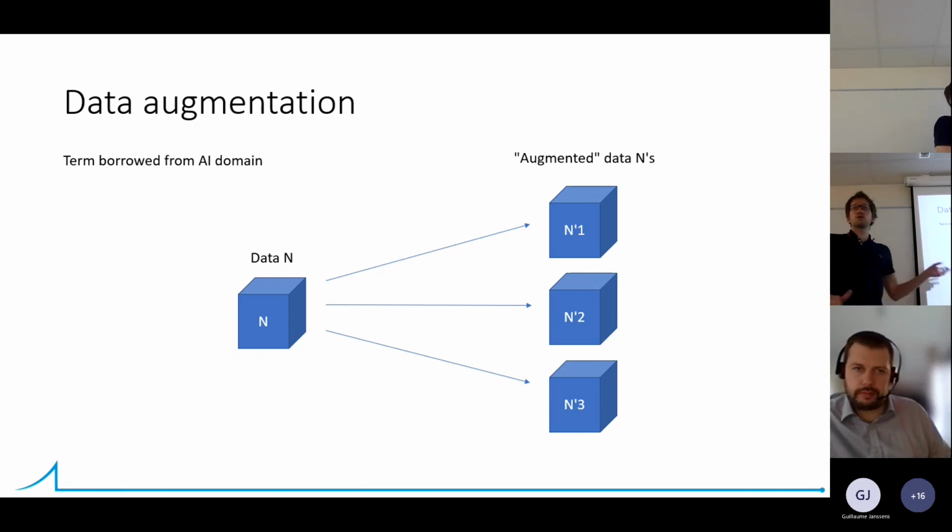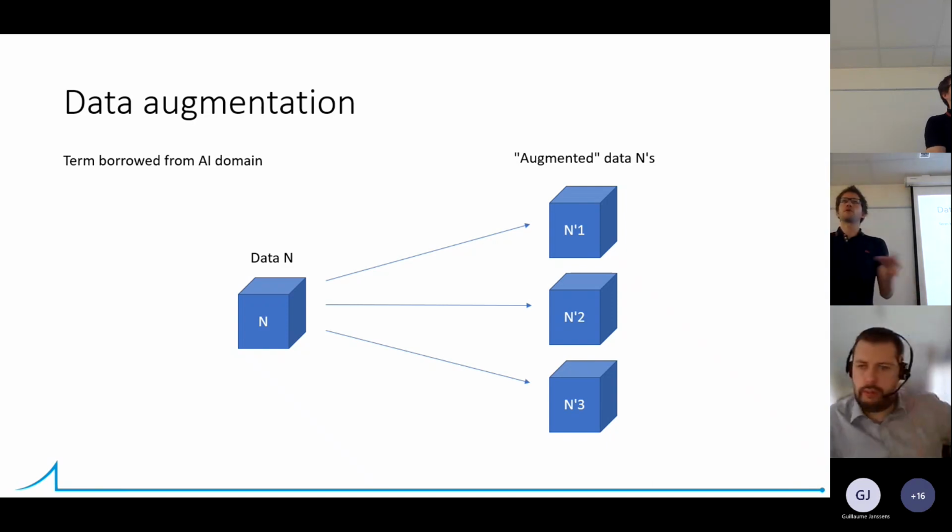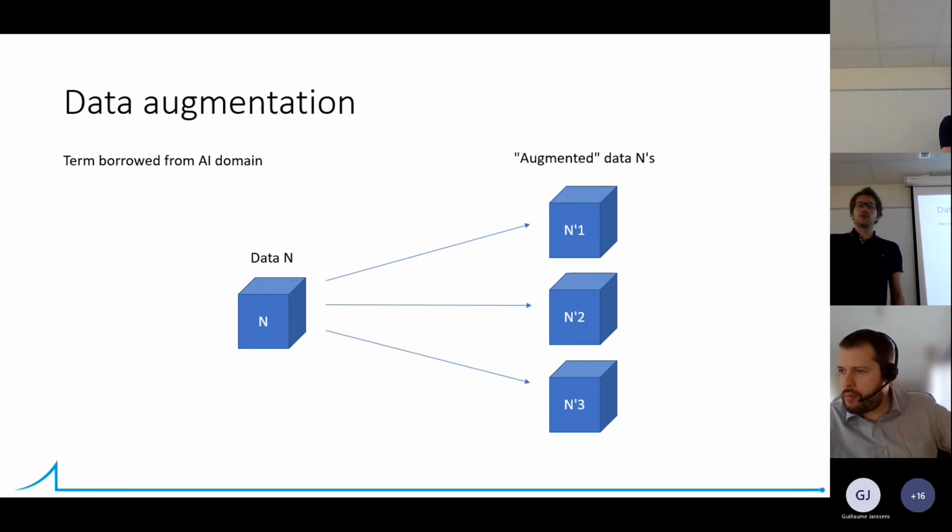And in our case, that's what we want to do also for patient-specific application in the breathing for a mobile target. So we have this patient, he will breathe a certain way, and we want to simulate different breathing patterns, different setup errors in the table and things like that. And so for that, we have this data augmentation tool, which is specific to a patient for now.